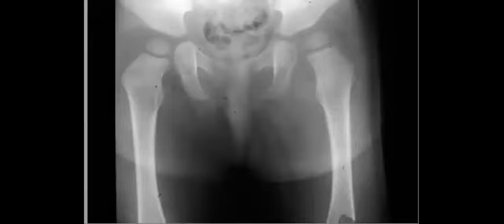So your differential will be very limited. Is the pathology on the left or the right? Left, Marwa. So the left fat planes are obliterated, and the left hip joint is widened. So which modality is the most important here, if you suspect what you mentioned? Ultrasound.